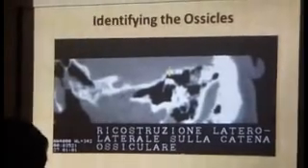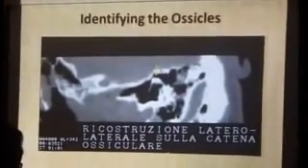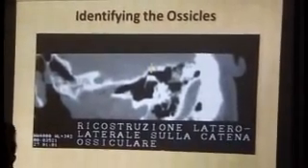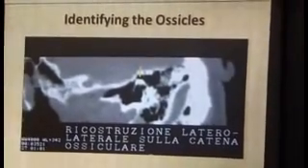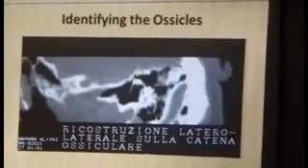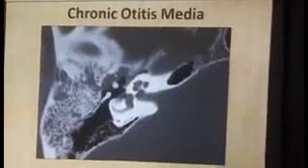It is helpful. If you do a sagittal section and you get this appearance, at least when you go in for a surgery, you know that out of three, two of your ossicles are already present. It's more of a positive value in its presence rather than its negative value in its absence, which can help you not only plan your surgery but also counsel your patient.